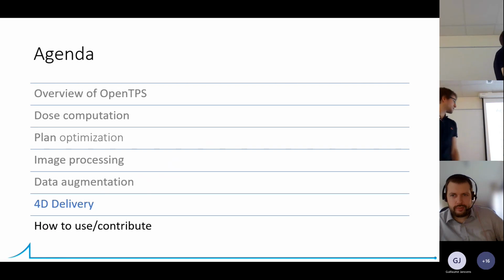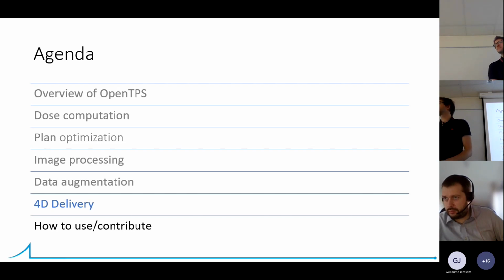Yes, that's it. So these dynamic 3D images can be shown in the GUI. I think you mentioned that it wasn't, but I think it is working. So you can show dynamic images in the GUI as well. That's it for my part. Are there any questions?